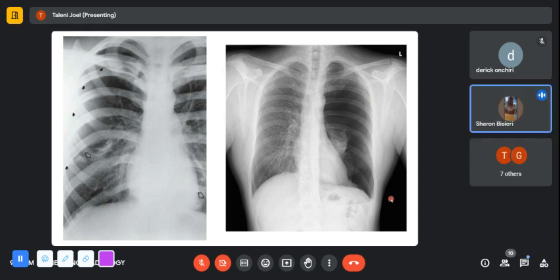And then the image to the right. We are looking at a PA chest radiograph, and on the left hemithorax we can see complete lucency with the left lung that looks like it's collapsed, and that area can be seen adjacent to the left heart border.